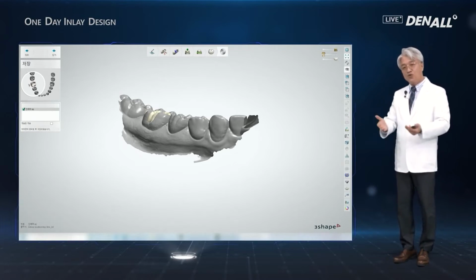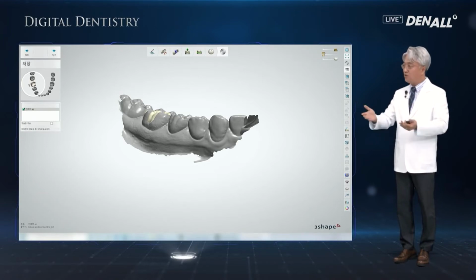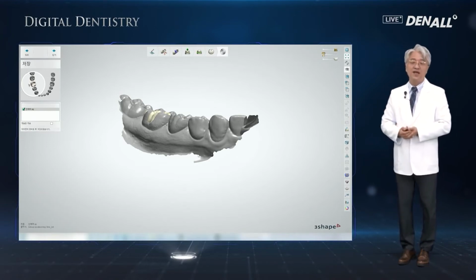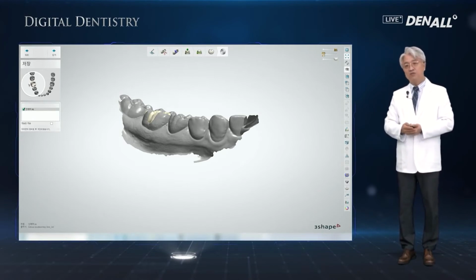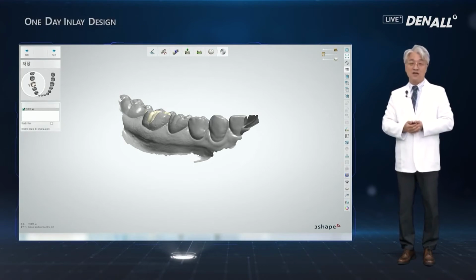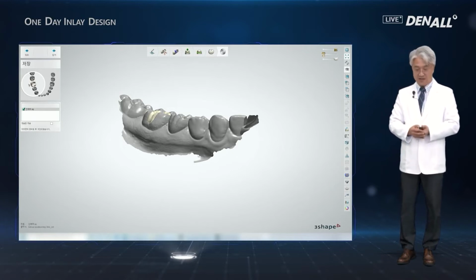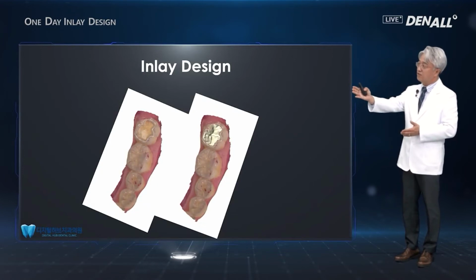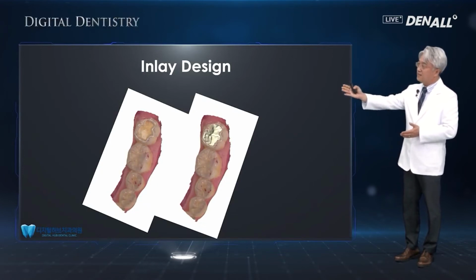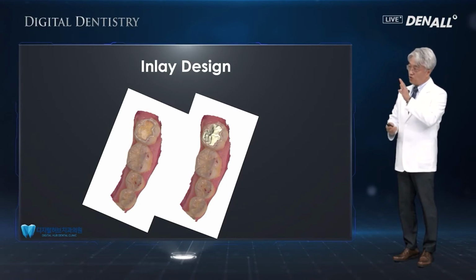And for this lecture, it took about 10 minutes or so, and I also did some editing. But once you get accustomed to this, then I assure you can design an inlay within 3 to 4 minutes, making the one-day inlay really possible. So that was the prep scan image, and this is the inlay design image.